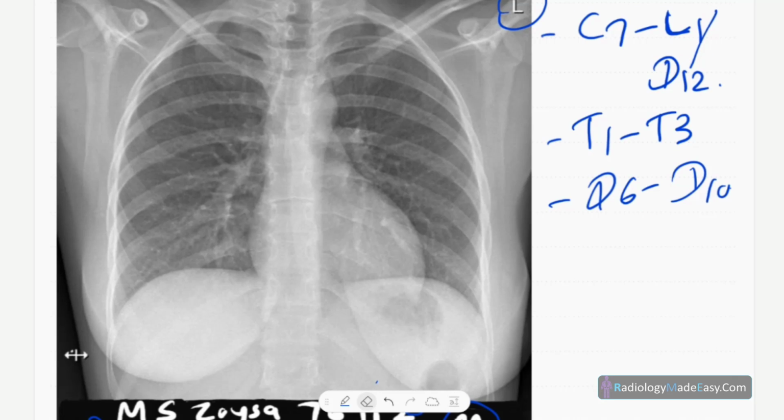Now we are going to start the chest X-ray interpretation proper. Actually you don't need mnemonics to keep in mind those things. The simple thing is you go from central to peripheral. Identify the structures at the center, then go to the periphery. First look at the trachea.